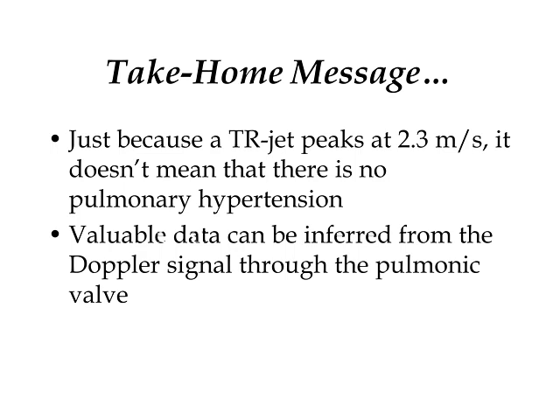But also in this case, the RA pressure is so high that the velocity of 2.3 was enough to give you significant pulmonary hypertension, and valuable data can always be obtained by looking carefully at the flow through the pulmonic valve, which is a valve which regrettably I think gets neglected all too often unless you're practicing adult congenital heart disease. In any case, I enjoyed this.